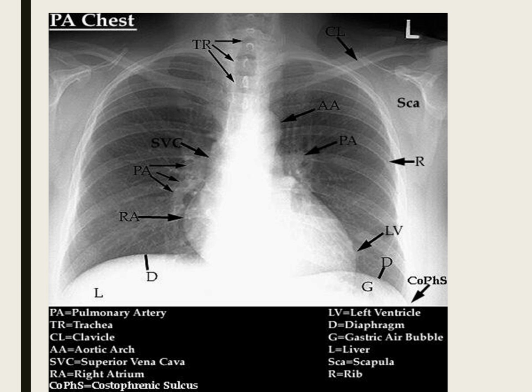If someone has chest tubes, you want to count them and see if they're in decent position. If they have an NG tube, you can follow it down below the diaphragms. B is bones: you can count the ribs, and note whether it's inspiratory or not, as I said.